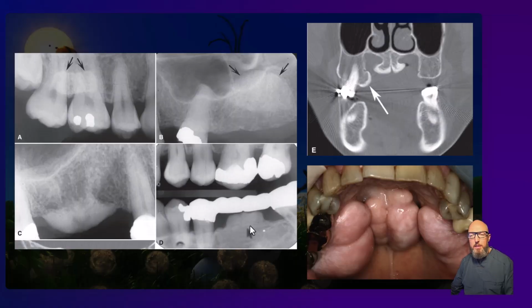How does bone respond to pressure? It creates more bone, and so that builds up. So that's something you might see, that subpontic hyperostosis. And here's an example of a patient. I've never seen someone with this degree of palatal exostoses, and it's touching his palatine torus.